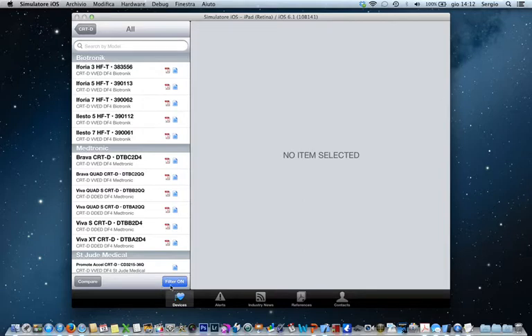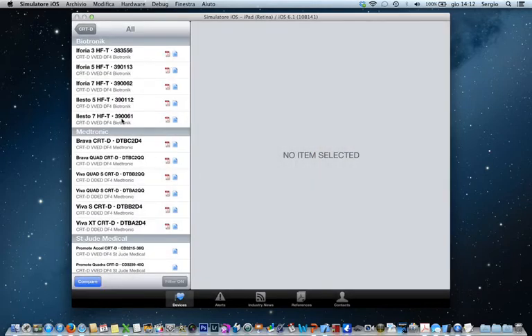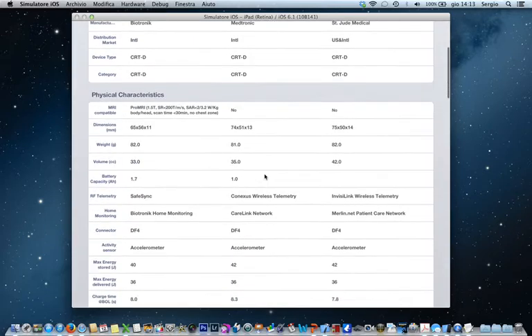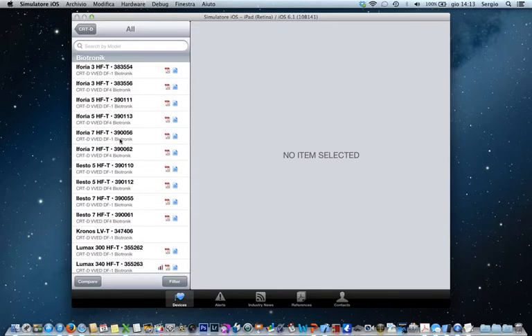You can see that the filter is still on, so it means that it remains applied, and in this situation you can compare the filtered items. For instance, I can again press compare and compare this with this with this. So in this case these are only 3, but it works again. And to eliminate the filter, you just press on it again.